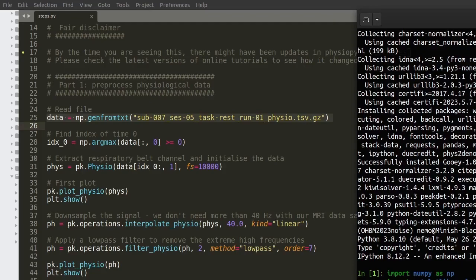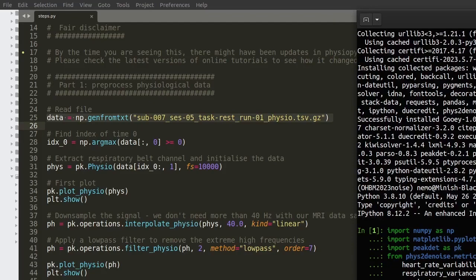So actually, if I do 0, you see that there it's basically an advancing array. If you plot it with Matplotlib, you will see a line. And the point in which this line crosses 0 is where the fMRI data started, as I said before. So we are going to find that point.